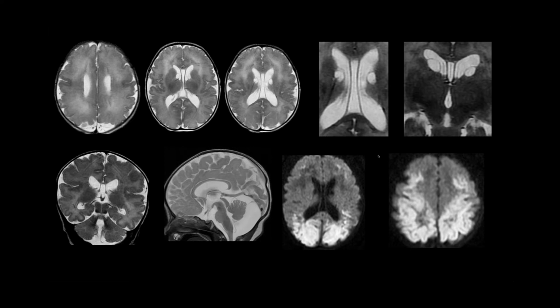And if this was hypoxia, then we would think about a sustained low-level hypoxia, right, with the parasagittal infarctions. Yeah.